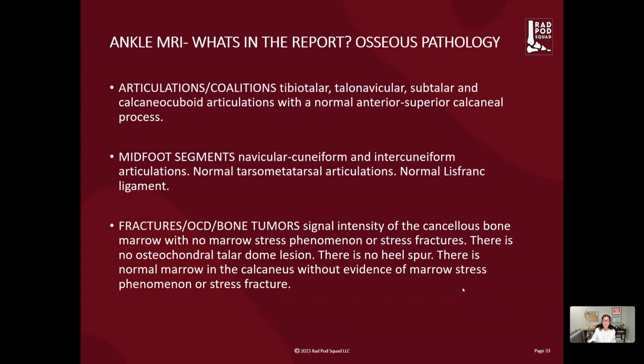For the midfoot, we're going to move on to take a look on an MRI of the ankle, the navicular-cuneiform and the intercuneiform. Looking at the midfoot, we'll want to see our tarsometatarsal articulations and normal Lisfranc ligament. We'll be looking for fractures, osteochondral defects, and bone tumors by assessing the signal intensity of the bone marrow, looking for stress phenomenon. We'll be looking to see a presence of an osteochondral lesion, whether or not there are heel spurs, whether there's any marrow changes in the calcaneus. Those are things you can expect in our report.